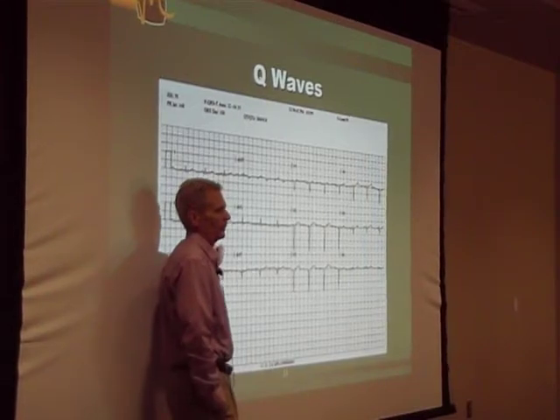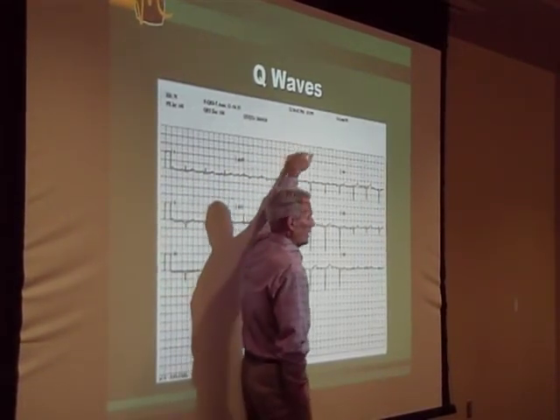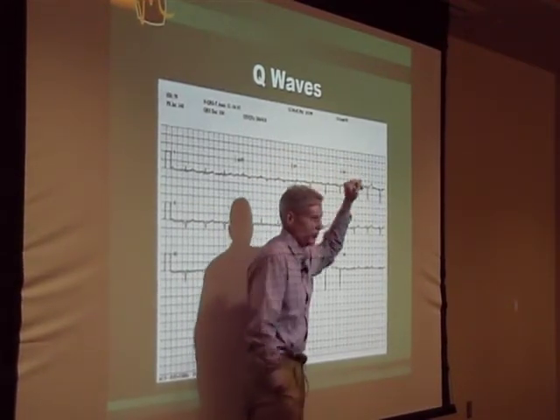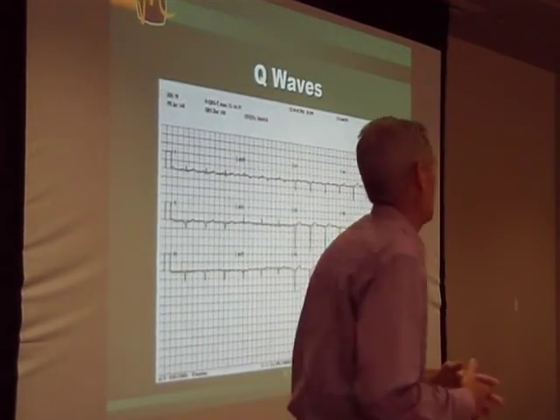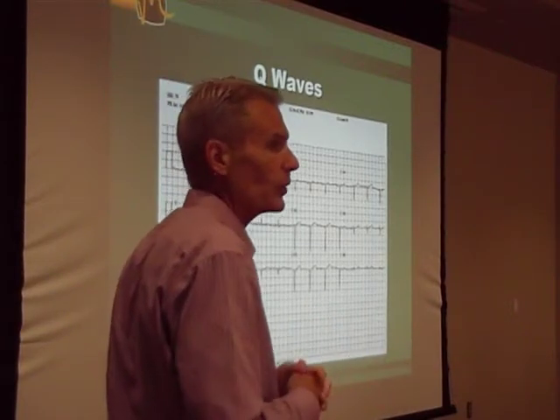Okay? This is where you might see up in your algorithm, inferior infarct, age undetermined. Anteroseptal infarct, or age undetermined. Again, if you did pick those up, not a big deal. But there's information here worth having if you know what to look for.